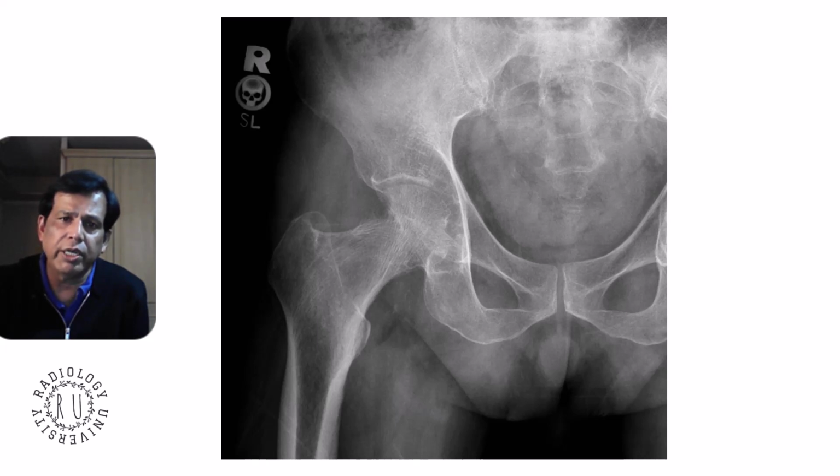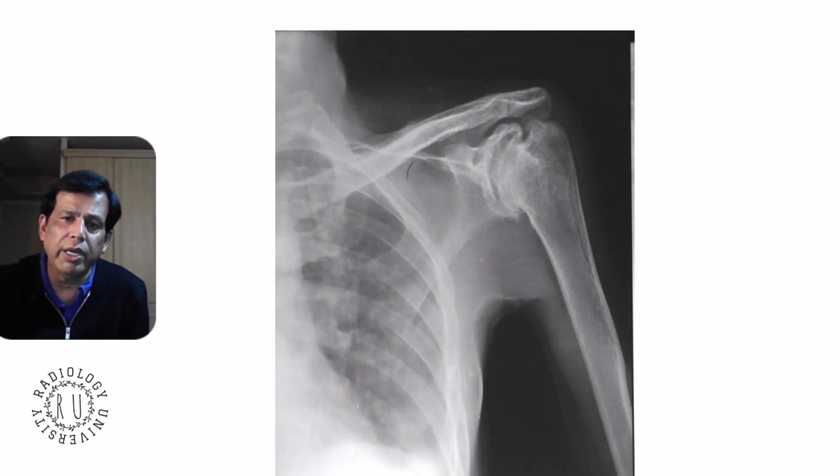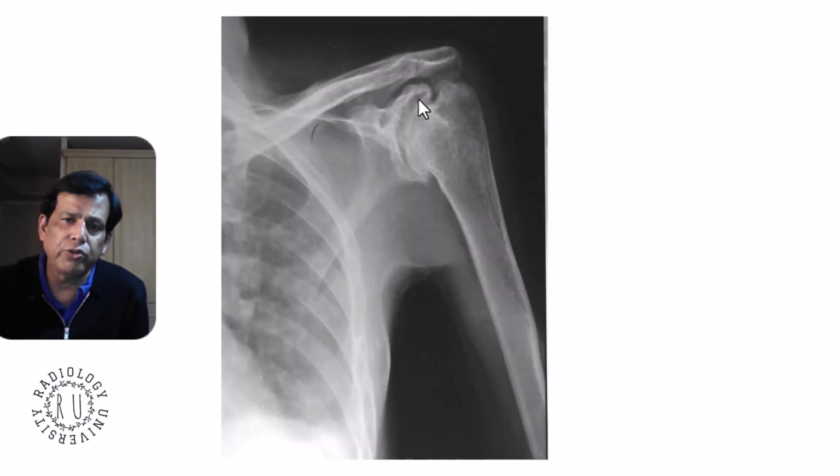So you can see another case related to the same pathology. In this case, this is more of a chronic phenomenon where you can see that the bone is more sclerosed, destroyed, a flattened humeral head, and this is like avascular necrosis of the humeral head. Joint space is still lost. There's a bit of sclerosis and scalloping, but this is not the same as that. So in this case, it is a joint destruction, but a chronic phenomenon because of AVN and sclerosis. So this is a tubercular arthritis rather than pyogenic.